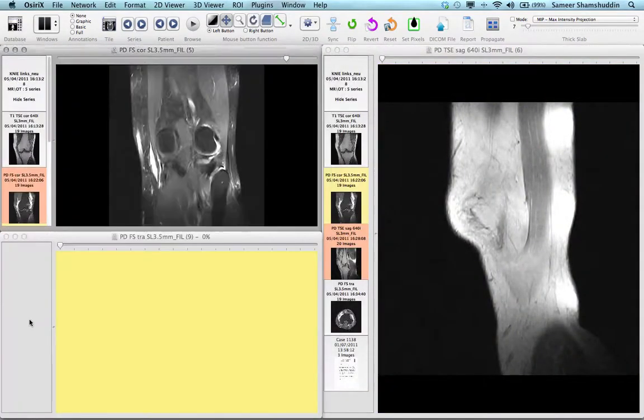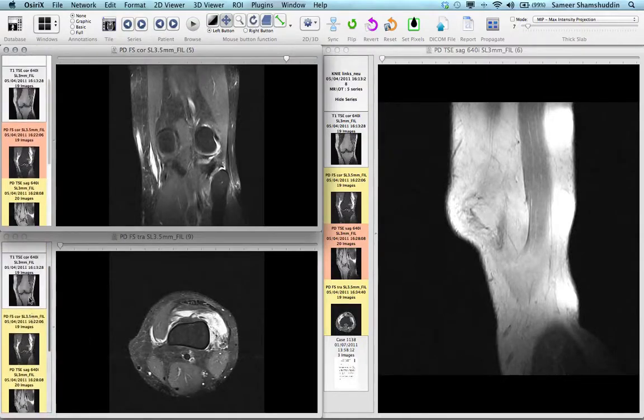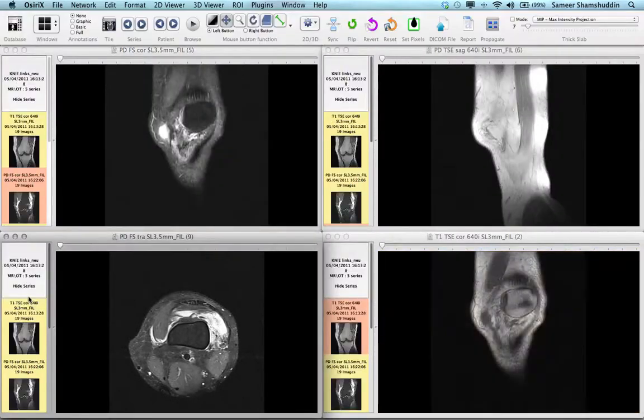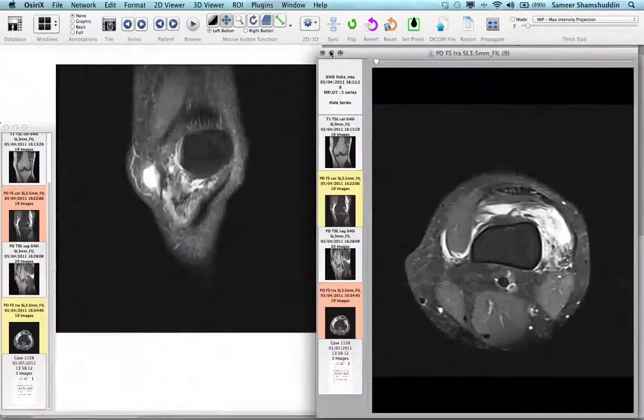Similarly, you can open multiple other windows, and this is called magnetic window in Mac, and that will automatically align onto your screen. So to close this window, you can select the cross button and close whichever window you do not want to see.